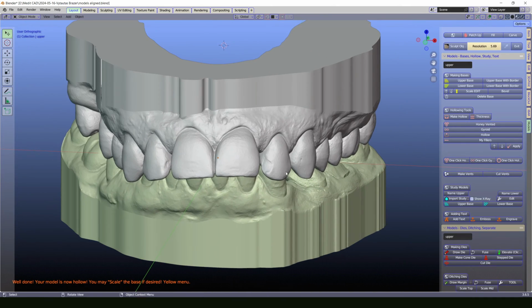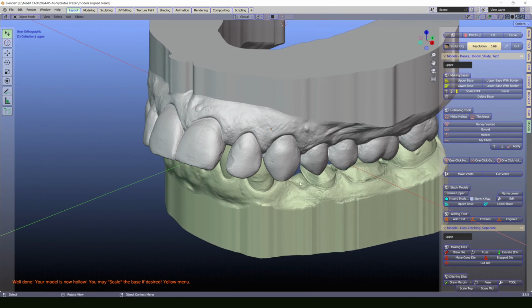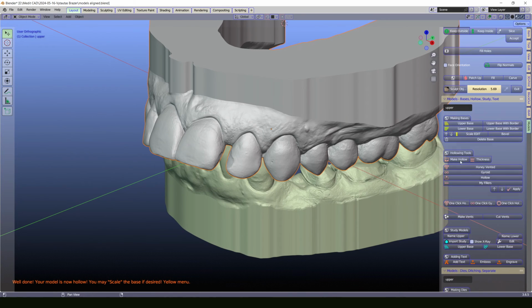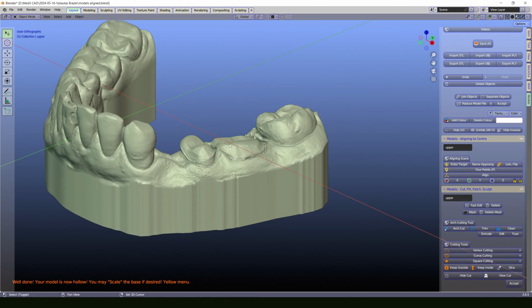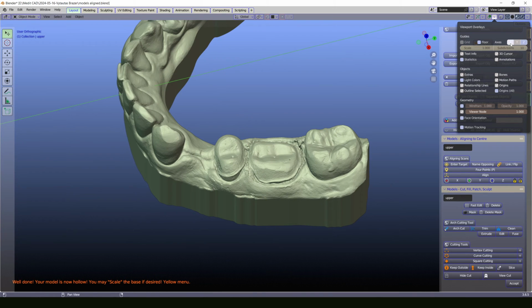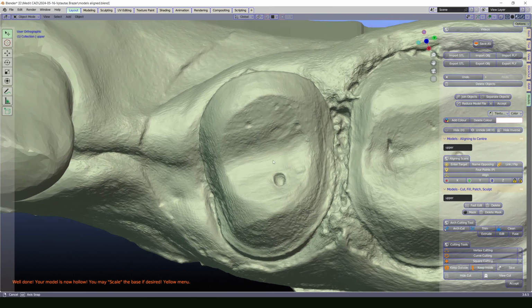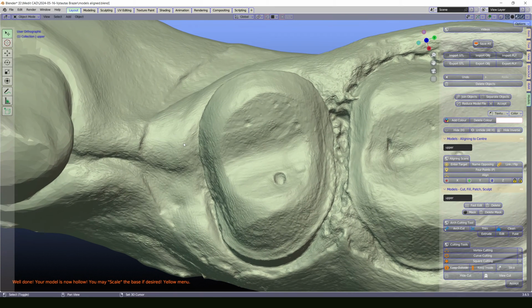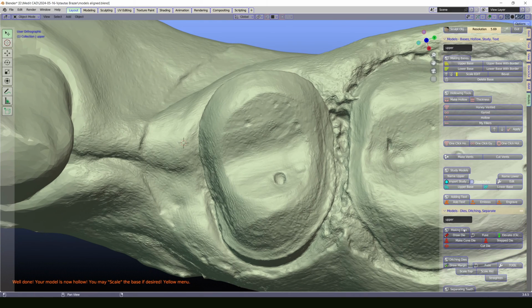And now let's try separating a die, a preparation. So we got 2 preparations on the lower jaw, so at least for now. Let's make the upper jaw invisible. Now we're gonna need to turn off these 3D lines. Would be more comfortable. And shift and right button to set a target. Let's find a making die tools. Draw a die. Okay, let's do it.